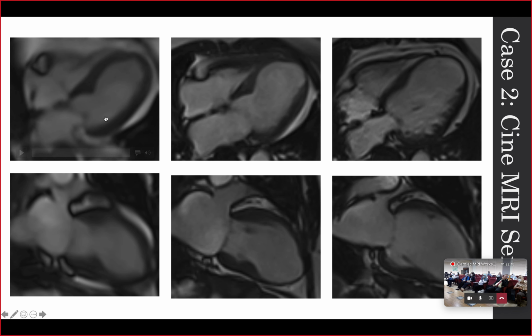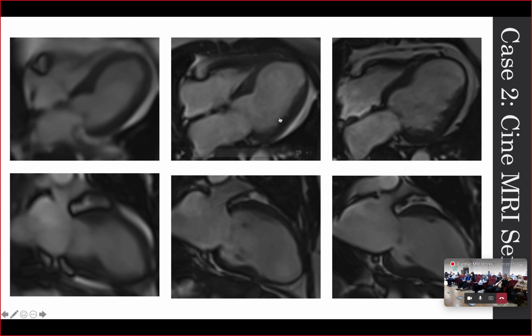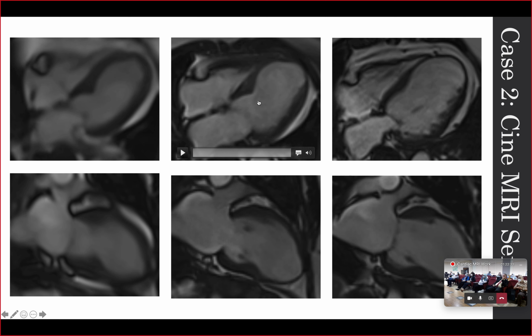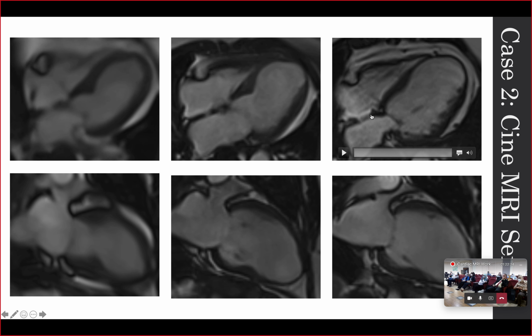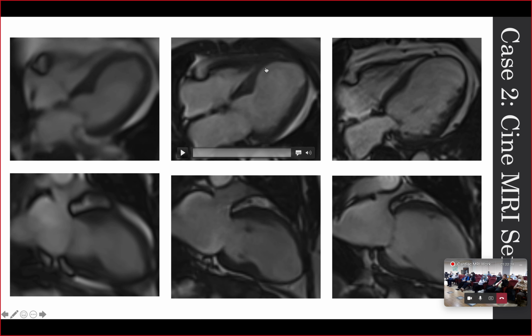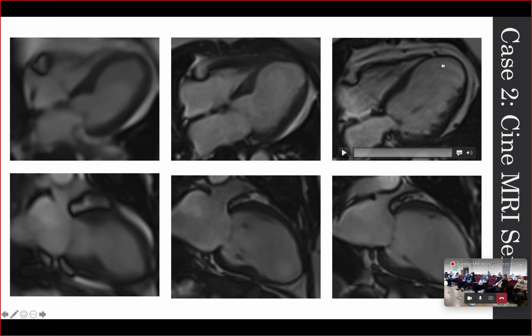You may see the size of the left ventricle, this is the remodeling and adverse effect. The size of the left ventricle is dilating across time. The myocardium in the LAD territory, the apical and the septum, is thinning out. Function is decreasing. This patient was admitted twice because of heart failure.